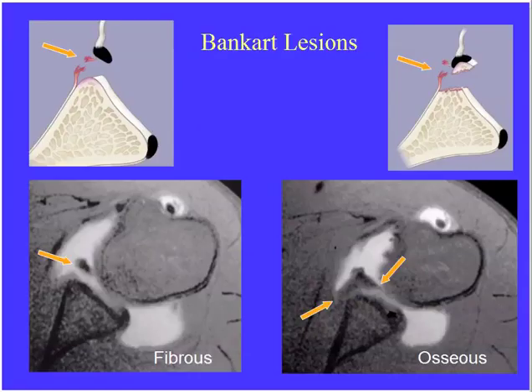Now, when we see an osseous Bankart lesion, either a fibrous or an osseous Bankart lesion, we'll see displacement with fluid coming deep between the osseous glenoid and the fibrous labrum, or you may see a piece of bone taken with this. So they would be likely to either ask you for a diagnosis, which is a Bankart lesion in this case, or an osseous Bankart lesion, if there's a piece of cortex taken with it, or they may ask you what the mechanism was that led to this, which would be an anterior dislocation.